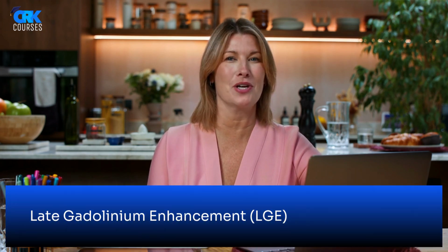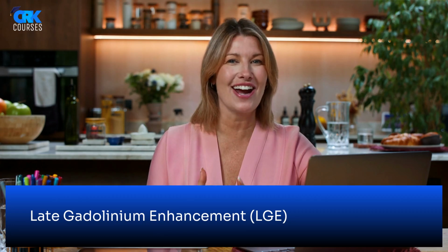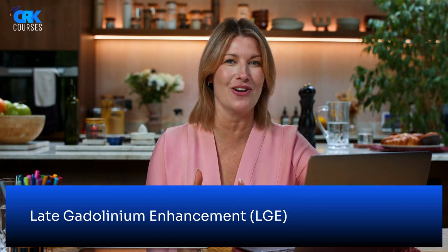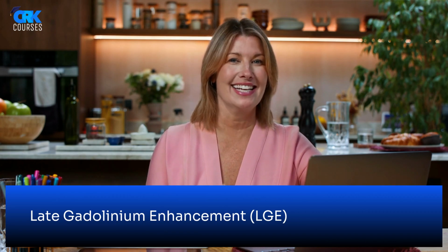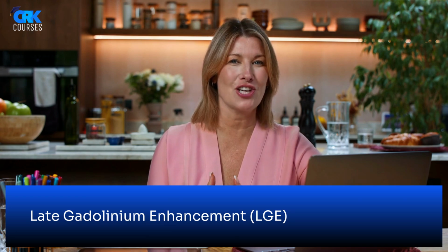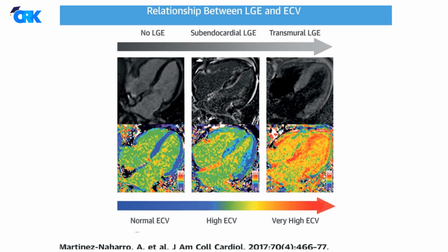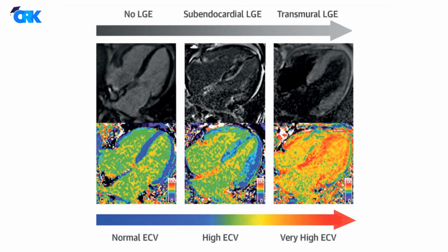One of the most powerful tools in cardiac magnetic resonance imaging, particularly for amyloidosis, is late gadolinium enhancement, or LGE. In transthyretin cardiac amyloidosis, LGE offers a non-invasive window into the pattern and extent of amyloid infiltration across the myocardial wall. As seen here, the process typically begins with no enhancement, then progresses to subendocardial LGE, and finally reaches a stage of transmural LGE, where the entire wall is involved.